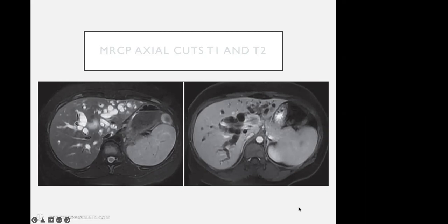You need to read that film. Whether the patient is having cholelithiasis, whether this pain is due to acute pancreatitis or due to choledocholithiasis with resulting biliary obstruction. So I think now you are well conversant with axial CT scan reports and films. You have seen the CT scan pictures.